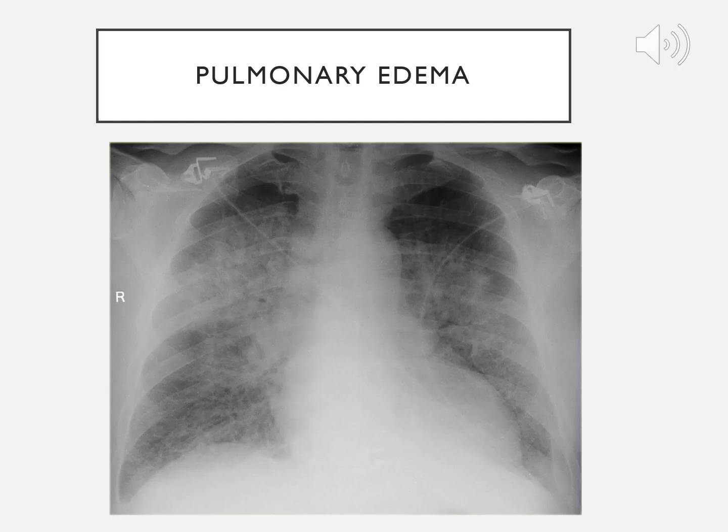So pulmonary edema, often indicative of congestive heart failure, but not always. Could be ARDS, which presents often the same way radiographically. You have to differentiate it clinically. You have to differentiate ARDS from a cardiogenic pulmonary edema versus non-cardiogenic. So this patient has it all. They look like they're in stage 4 with alveolar involvement.